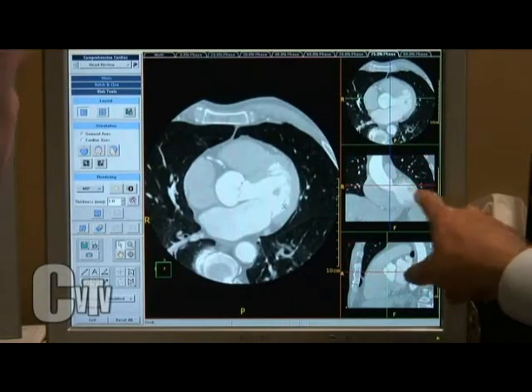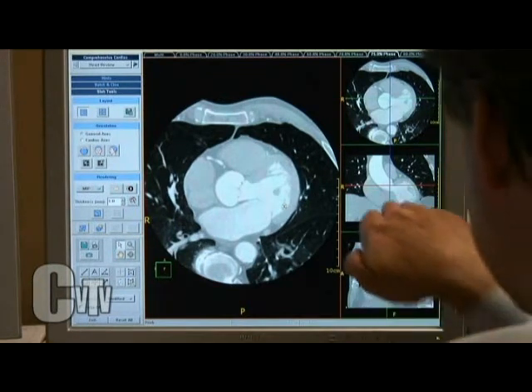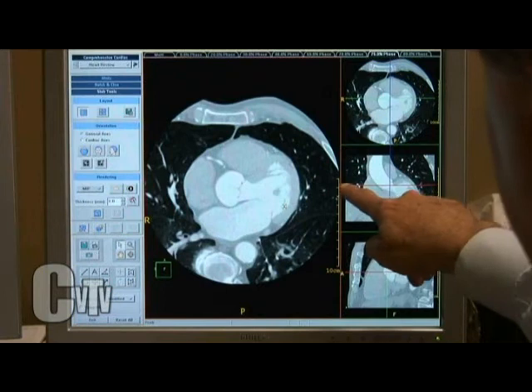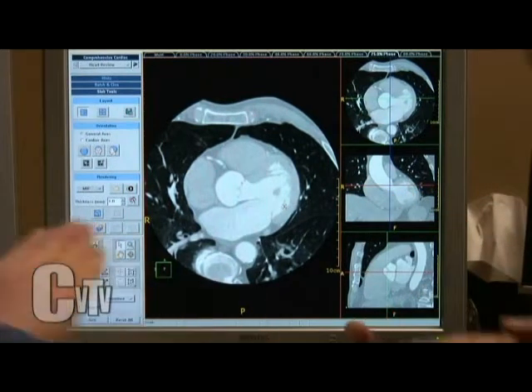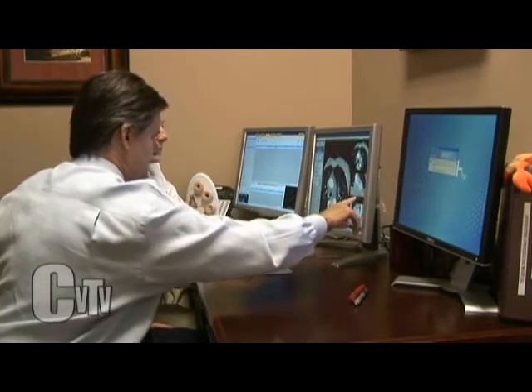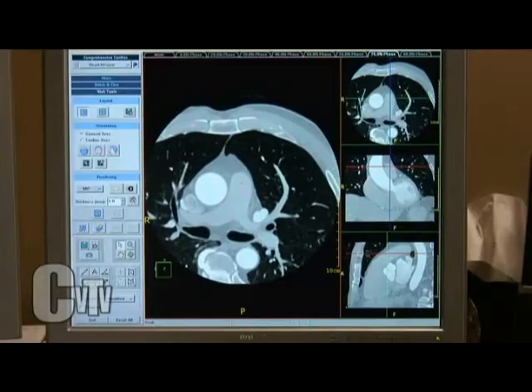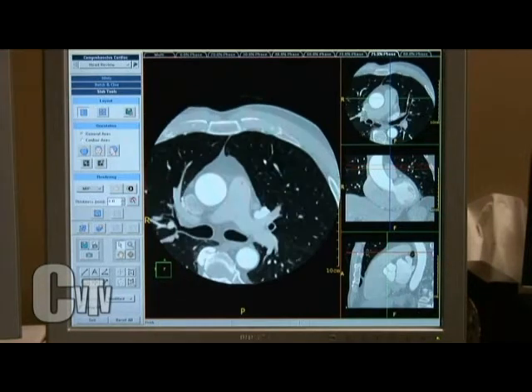Okay, so this is looking at it like we're standing in front of the person and looking toward him that way. This is like we're down at their feet, and you're taking a credit card level slice of them, and we're looking at them going up and down toward their head. That's correct. This is their neck, this is their feet. You got it. And this is what we're looking at from the side, or from the bottom. Exactly. And so what we're seeing here: breastbone here, spine, right lung, left lung, heart in the middle.